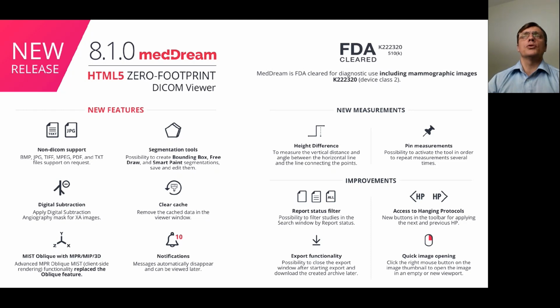In this case, you need to register this, but yes, we're not getting subtraction, send it to our support, and we will investigate your data, and we will try to do fast fixes to maintain your data. This is very important for you to know, but as far as I tested, all data is visualized, but still some data exists which could be saved differently. But you need to know that the function itself for the digital subtraction is already done for the angiographic data.